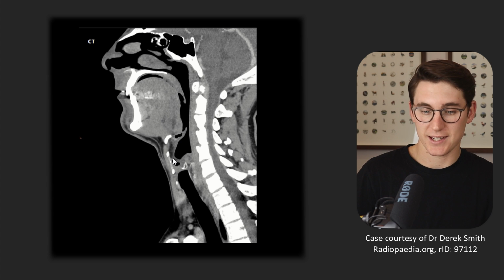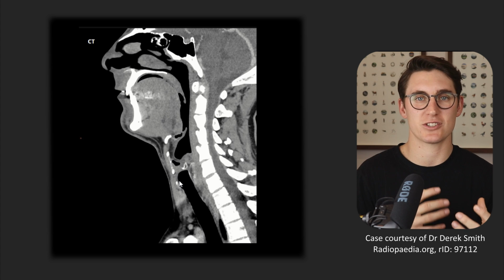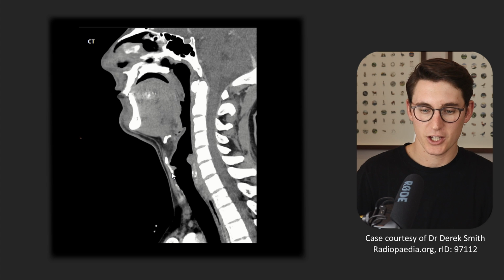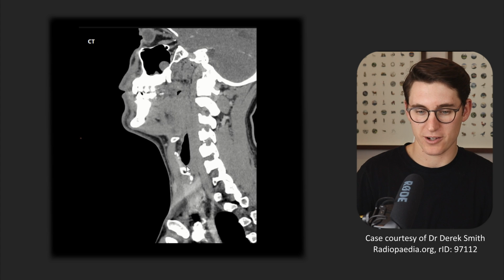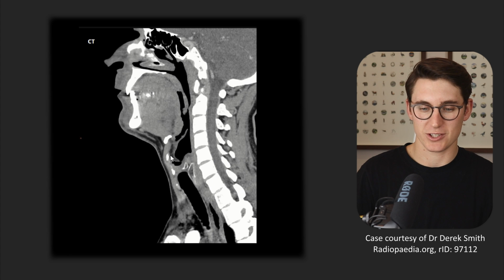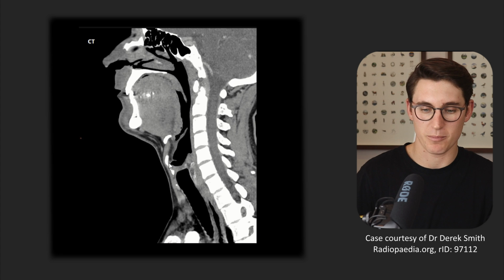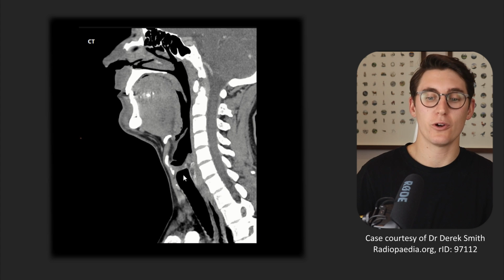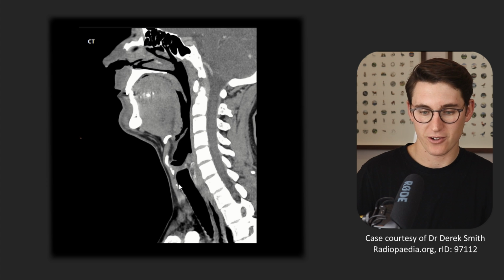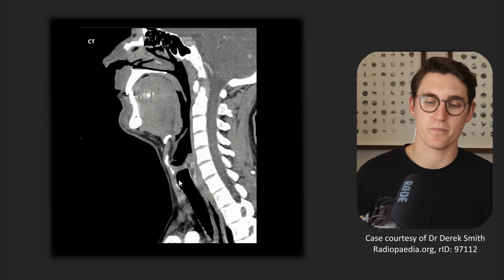The epiglottis then heads down to our thyroid cartilage, and I've actually chosen this image because the cartilages in this patient have become a little bit ossified and makes it more easy to identify them on a CT. So we can see our thyroid cartilage wrapping around here all the way down with our superior and our inferior horns, coming down to the anterior portion with our laryngeal notch of the thyroid, the Adam's apple that you can feel on the male. Below that thyroid is our large posterior portion of our cricoid and our anterior portion of our cricoid. There's our cricothyroid membrane between the two.